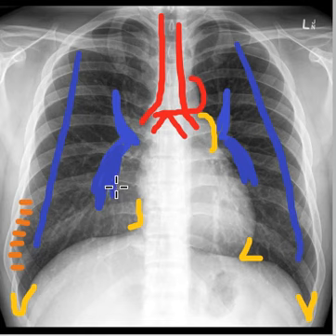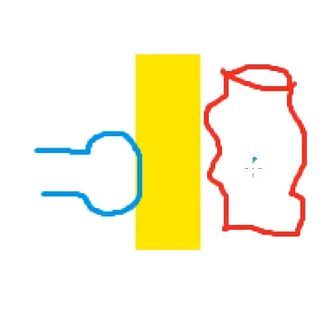So when edema develops, they all become very mixed up, and you can't tell which is a vessel and which is not. This finding is known as the hilar haze. After this vascular congestion leading to interstitial edema, the final thing that happens is that the alveoli will now develop edema, and we call this alveolar edema. So this is the third finding that you see on a chest x-ray.